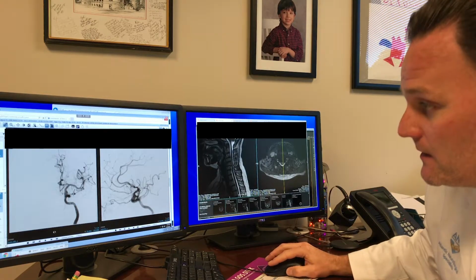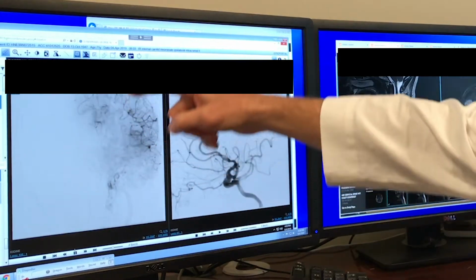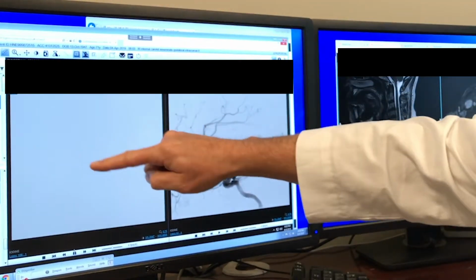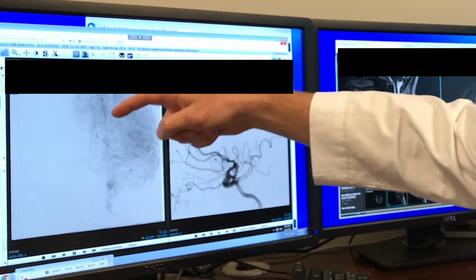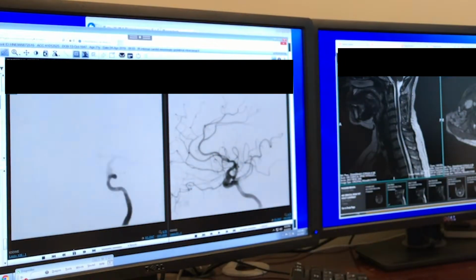But like right here, this one. So this is the flow in the artery, right? So this is normal blood flow. It goes out into the brain, and you don't really see it. Now it's recollecting in the venous system. This is the venous return going back to the heart. So this is the artery phase, tissue phase. Starting to recollect, this is the venous phase going back to the heart.